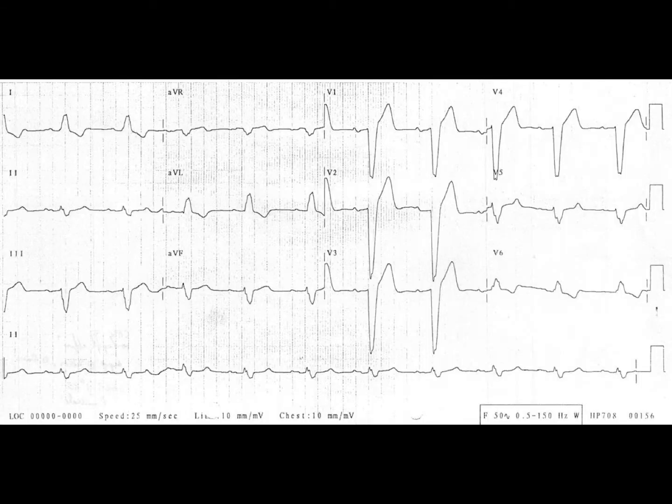So here's an ECG demonstrating a typical left bundle branch block. You can see that the ECG is in sinus rhythm. It's a regular rhythm. There's a broad QRS complex with an M pattern in lead 1, aVL and lead V6, which is typical. I'm not intending to go through all the variants of left bundle branch block and typical ECG features. I'd refer you at this stage to ECG Made Easy or Marriott's Practical Electrocardiography to help with that. But have this ECG imprinted in your mind, and let's start with the first case.